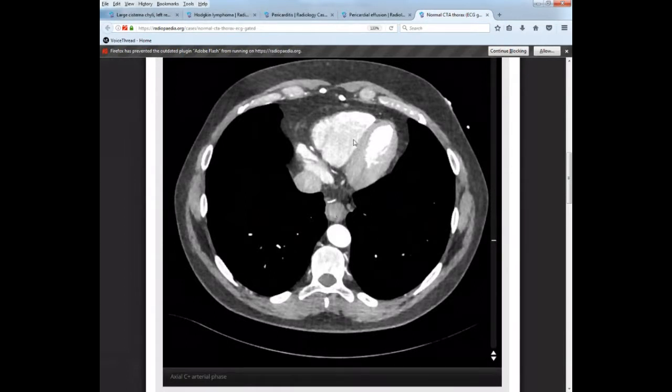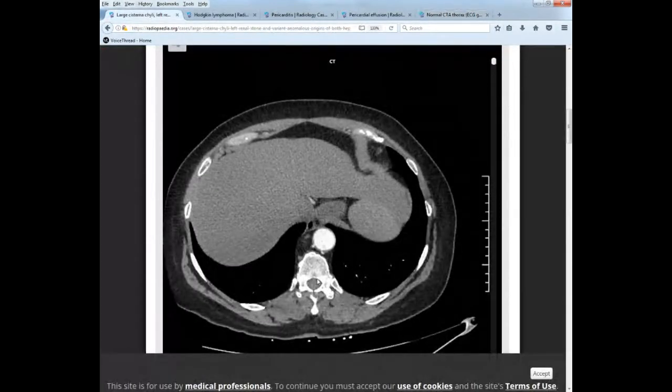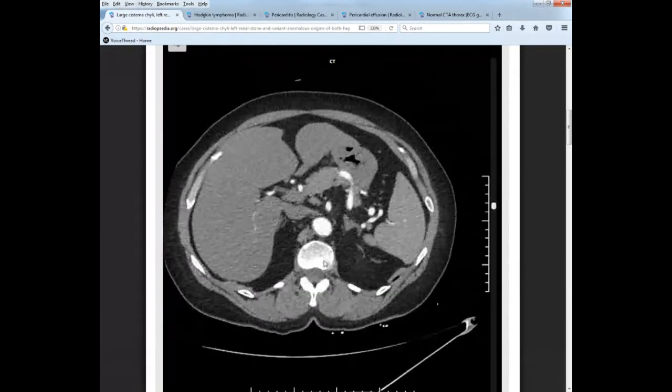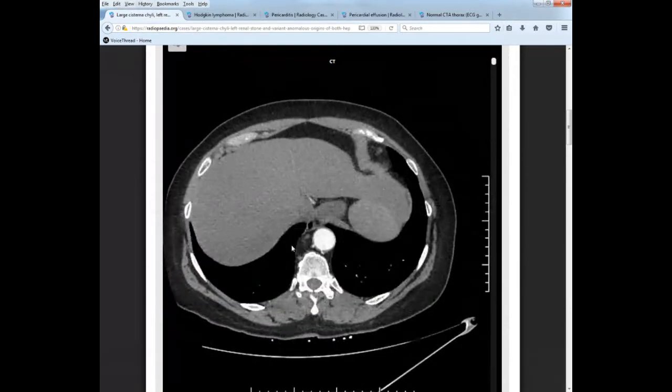Moving on to the lymph system, I'm going to switch over to the cisterna chyli. You're not really going to be able to see the thoracic duct unless there is an abnormality with it. So what I want to show you here is this little area right here is the thoracic duct superiorly.